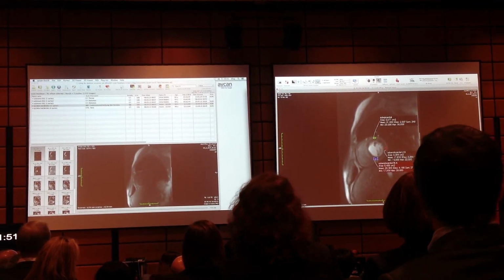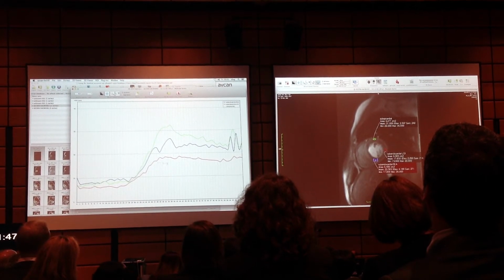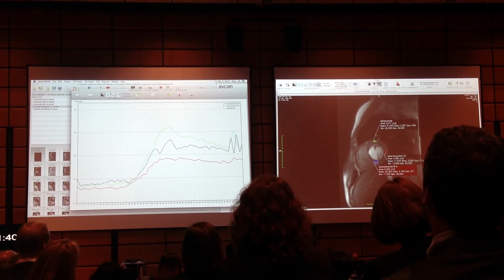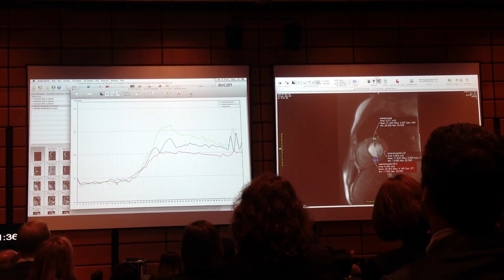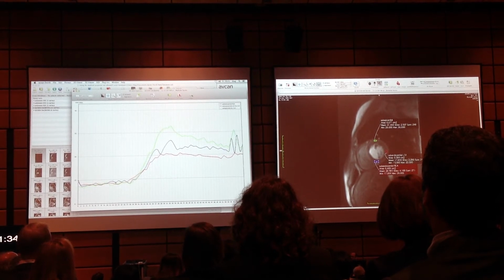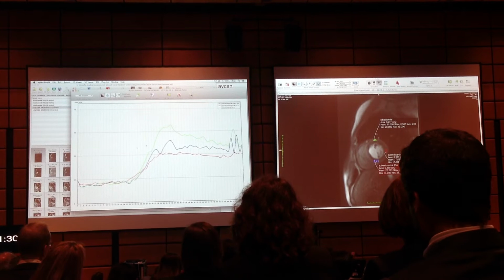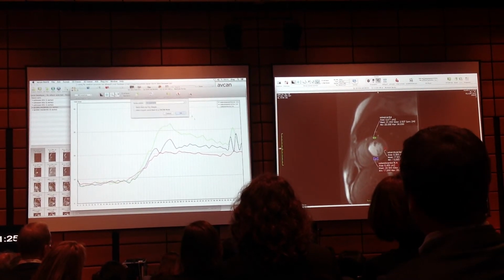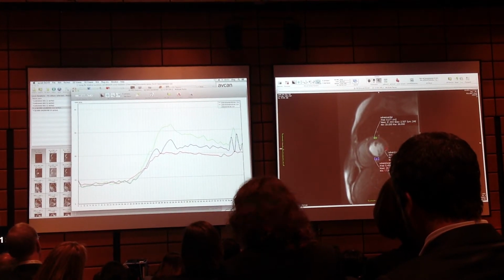So then I will push that to our 4D analysis, and you get the time diagram for the values, and we can do a coil correction, a baseline correction, that we pull all 3 baselines over each other, and then you see that the one part has a higher slope and is getting a higher value. I can also export this to PACS and send it to the colleagues.